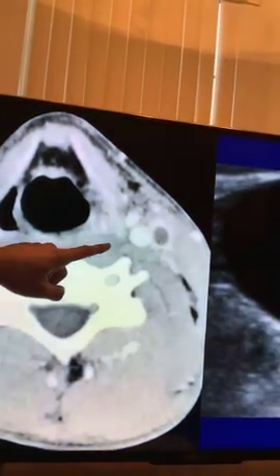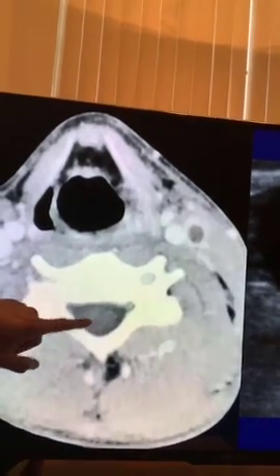Once again, remember, that's your thrombosed IJ over there, right? Remember, it's a CT scan, bright, bright, bright. Remember Lemierre syndrome, that can be from the septic emboli that go to the lung. Remember the bacteria. Remember that veins are always bigger than the arteries. Remember to see the needle inside the IJ, the actual vessel. All right, that's what ultrasound guidance is for.